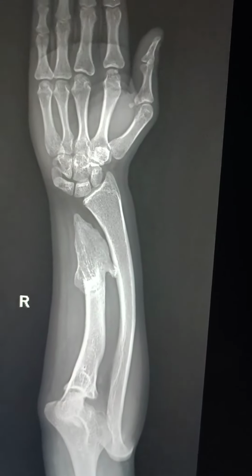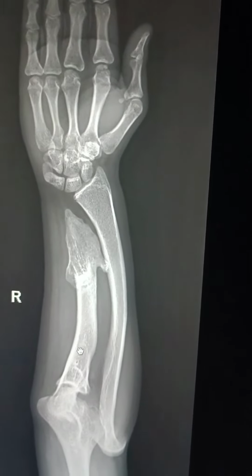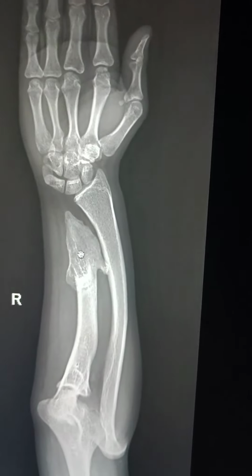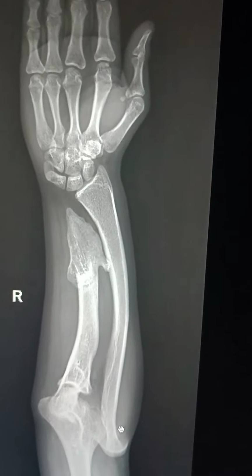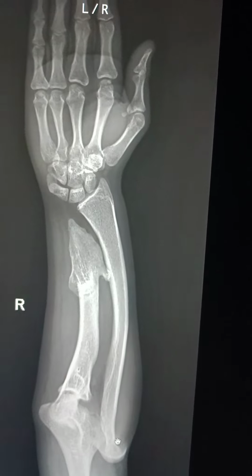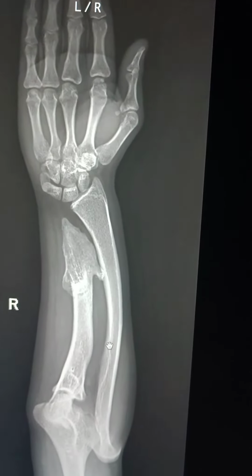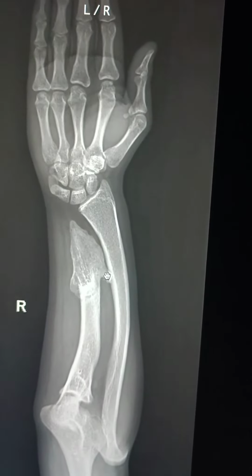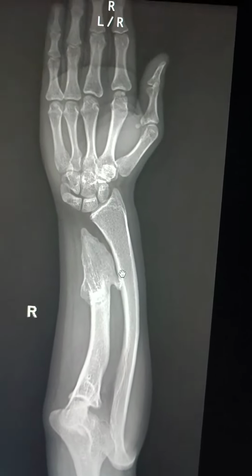This is another X-ray of the same patient, of the elbow with the forearm and the right forearm with the wrist. Here we can say the distal end of the ulna is not visualized, with shortening of the length of the ulna. The proximal end of the radius is not showing articulation with the capitulum of the humerus, which could be because of dislocation. There is evidence of sessile bony growth at the distal end of the ulna, of size approximately 13 by 9 mm from the cortex, which is continuing with the parent bone. So this is also exostosis.